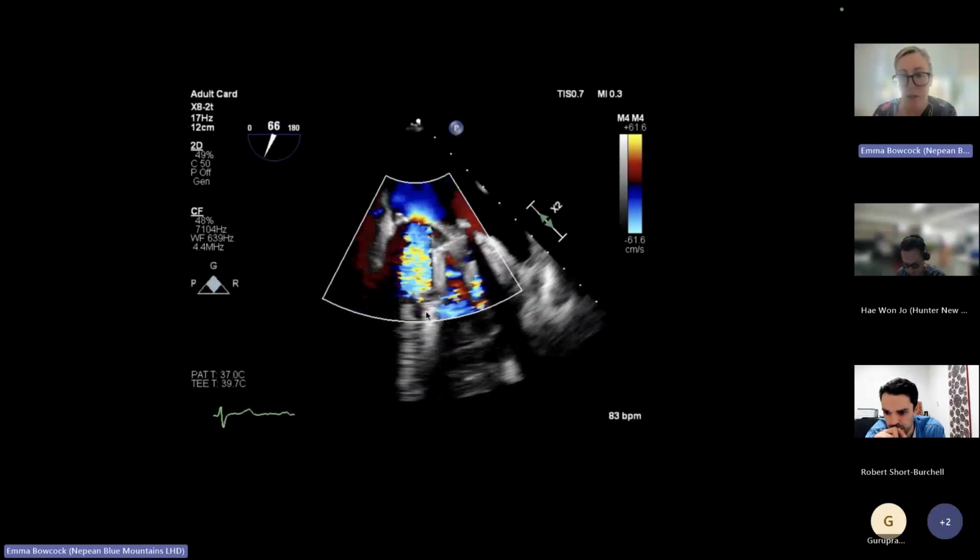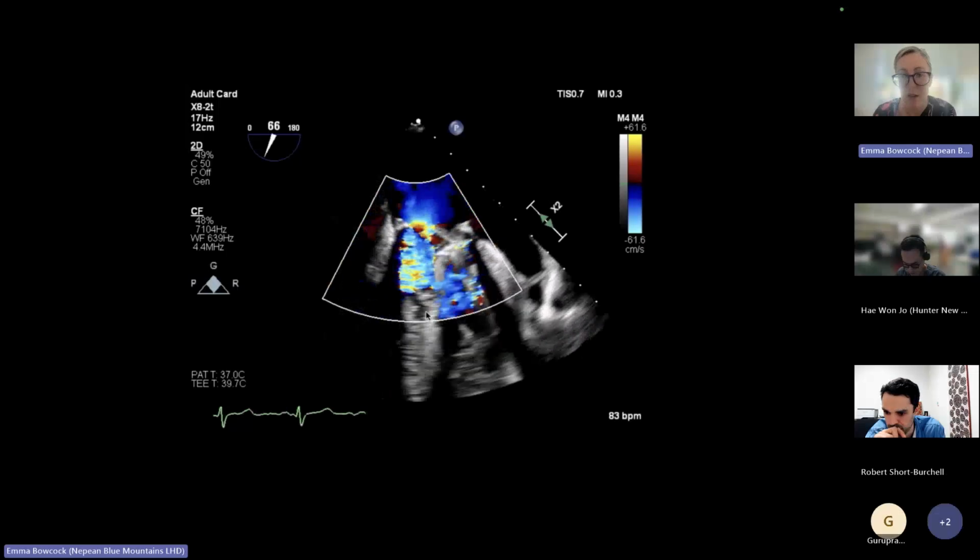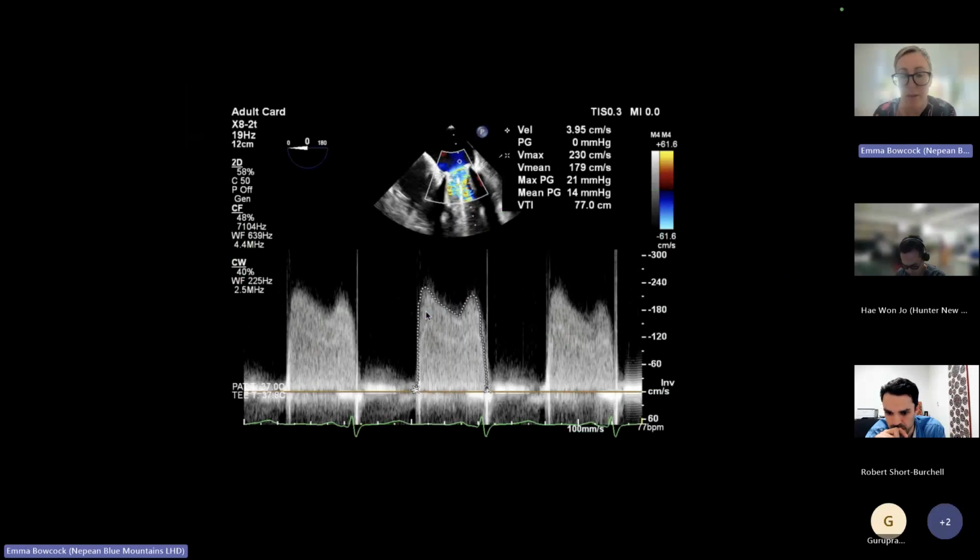And yeah, just seeing the obstructed flow pattern coming through and the high gradients, which, as you said, all fit with a severe obstruction of this mitral valve. And I think your management plan was great, an urgent surgical discussion. You can either thrombolize or she can have surgery, or you could potentially just anticoagulate. And it's all about balancing the individual factors for that patient. They're never quite easy to manage, particularly outside of a cardiothoracic center.